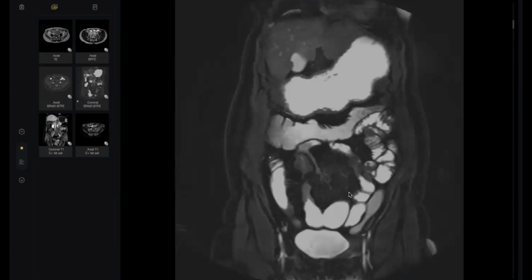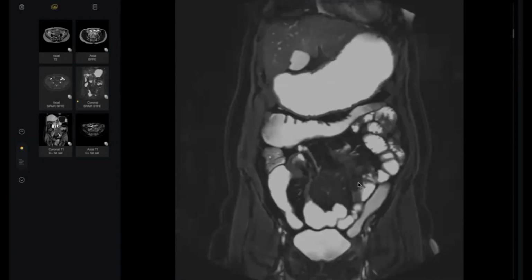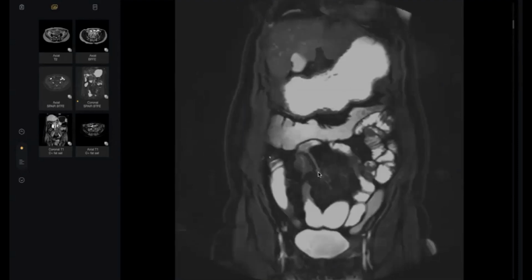See, this is bowel loop attenuated, and there are connections from bowel to bowel. So Crohn's disease, I will think of in terms of Crohn's disease. Excellent. What are the complications that you see here?